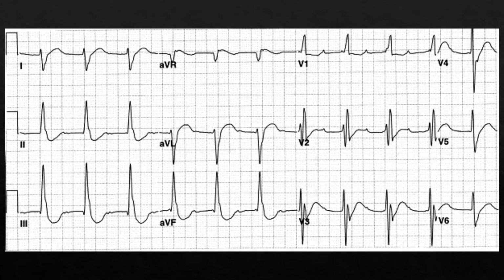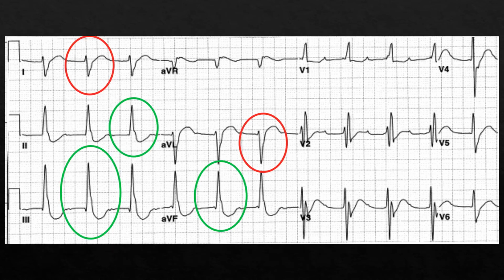Okay, here's another example. So ignore your precordial leads over there. Look at our hexaxial leads, 1, 2, 3, AVR, AVL, AVF, which is how we diagnose these fascicular blocks. When we look at this, you see lead 3 is your most upright, giving you a rightward axis. And let's zoom in here. There you go.